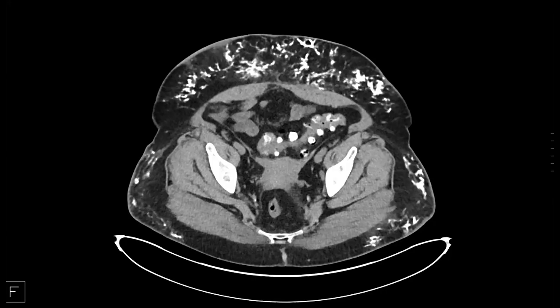Okay. So, I was about to say dermatomyositis when we see all these plaque-like or sheet-like calcifications. But since you said renal, I thought it was probably that. One more thing with calciphylaxis is that the overlying skin gets ulcerated, so that's not the case here. But even with the other differential that I said, uremic arteriopathy, it's not easy for us to differentiate on radiology. It will still look like what it looks like here.